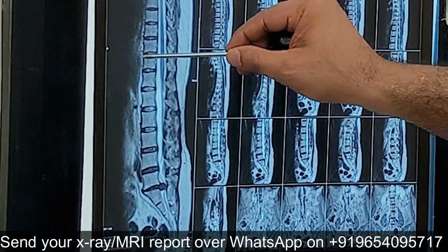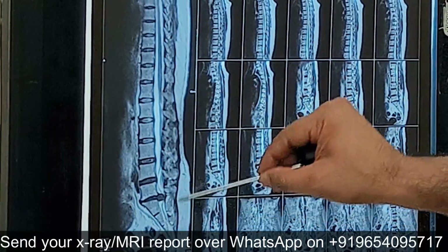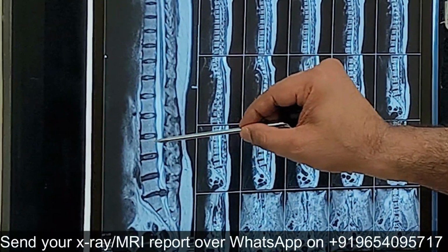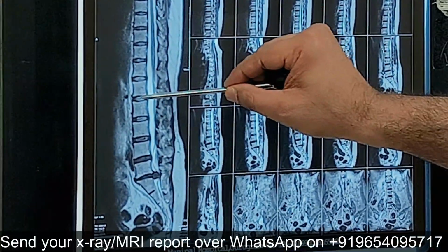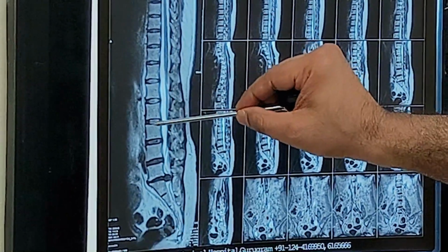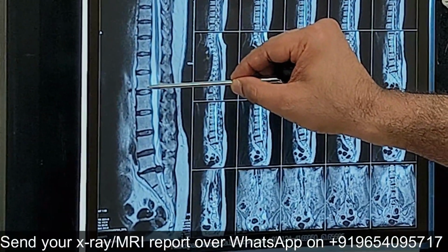So when you get your MRI film, there will be a cut like this. This is known as the sagittal cut. In this cut you will see square structures like this. These structures are the vertebrae or the bones, and you will see a thin sheet-like structure between them. This is known as the disc. So this is the disc and this is the bone or the vertebra.